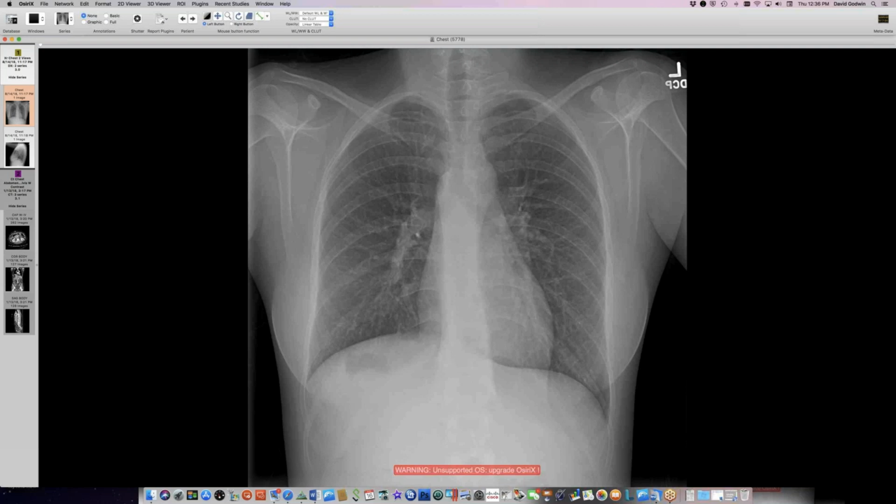It totally rocks. Okay. So Howard, apropos of a case you showed last week with a subtly widened, elongated mediastinum, this case popped up. Yep. So mediastinum. What do we think? Okay, so let's have a look.